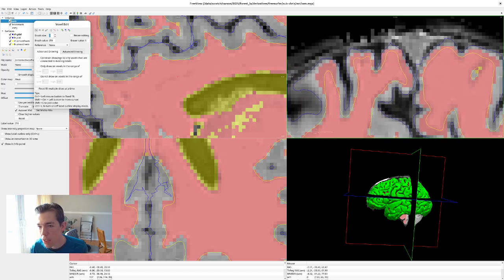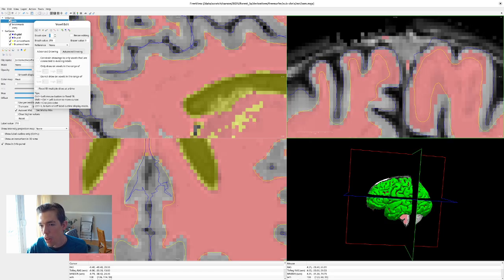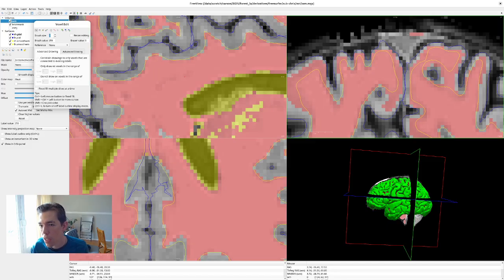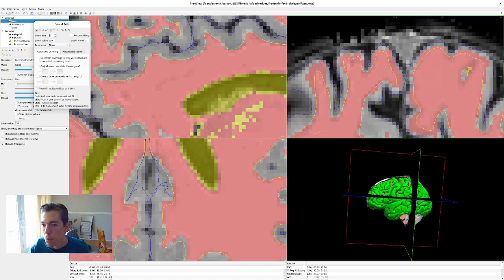So looking at this, there's some weirdness here, right? Like this is a weird sharp point. We'll page up and page down to go through the slices. Not sure exactly what's causing it to be sharp like that. I mean, this is obviously something that shouldn't be there. That's not white matter. It could be that those things are causing it through some kind of averaging. Just filter through the slices and correct things. This is how we do it. But there might also be some other weirdness here.